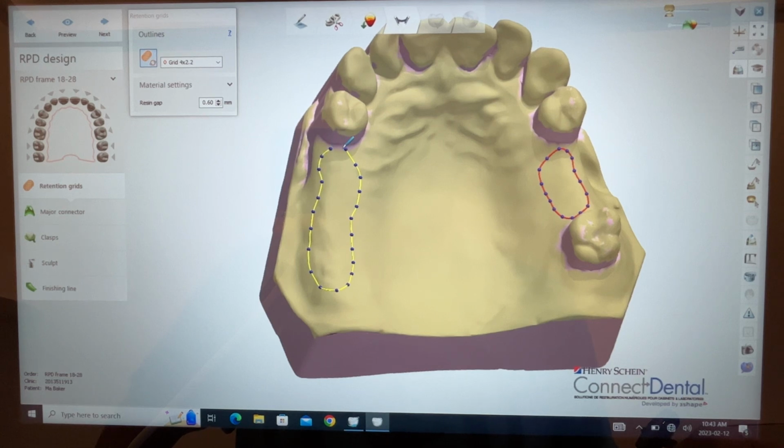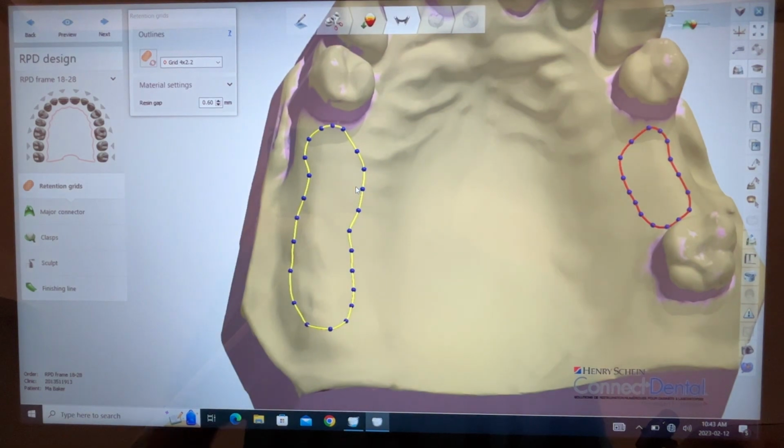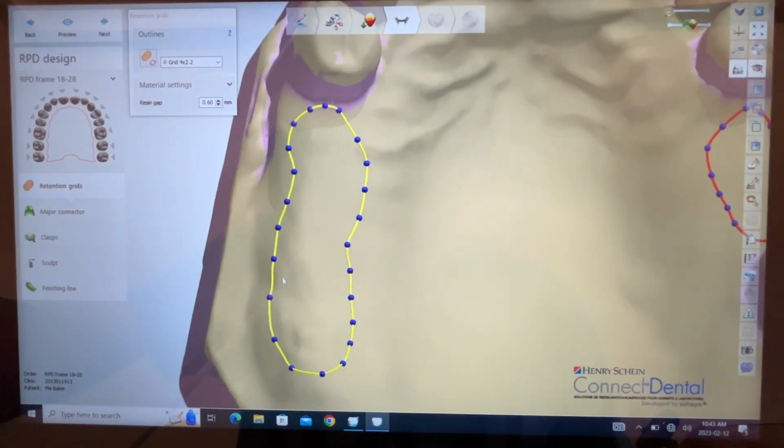And then close, I'll put one more in there. I think I want that one. And then close it there. And then if I hover over and click it, I can move that. Let's zoom in a bit more to see what I'm doing. I can move this over here.